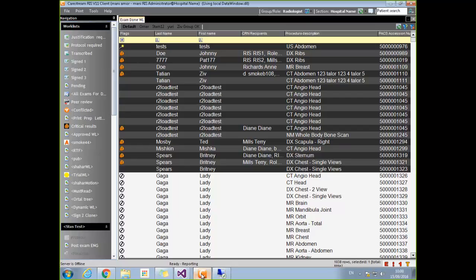Maybe we should disable the context aware chat when the patient is VIP? No, if it's a VIP you can still chat on the context. We just want to make sure that you can't launch any of the RIS actions from that nav bar for a VIP patient you don't have access to. When you open a chat, only people who are allowed to see this VIP.